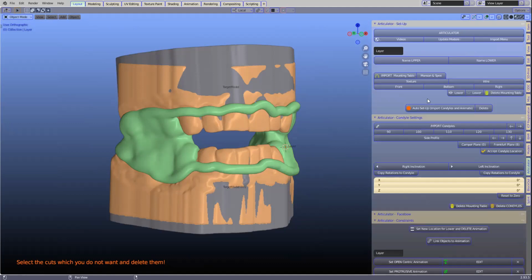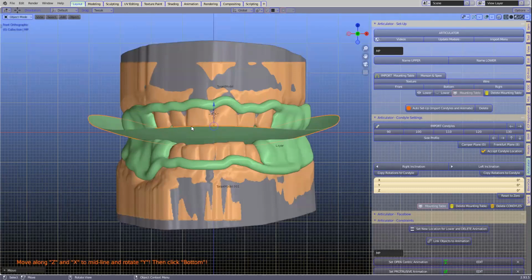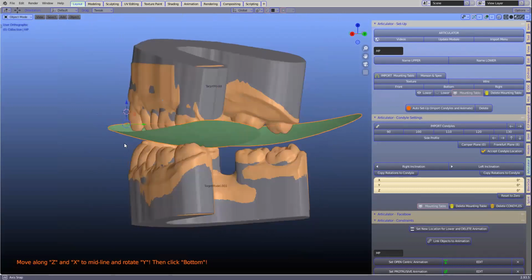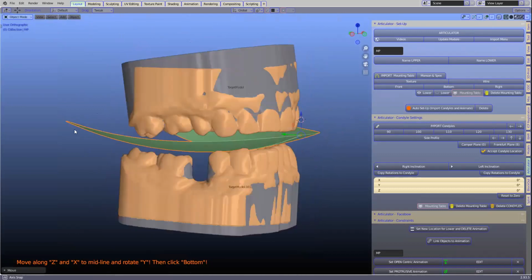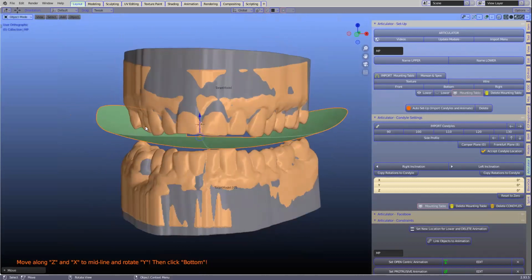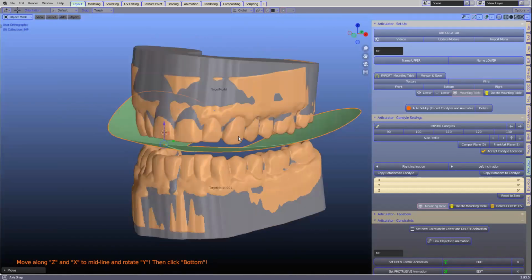Articulator. Let's import the Monson and Spee. I've never done this, by the way. Okay, here we go. Okay, let's have a look. Hide. We have to make sure. Hey, it sort of fits all right, doesn't it? Well, it is a natural phenomenon. This kind of studies say the curvature works this way. Okay, so we can bring it forward and back, and there you go.